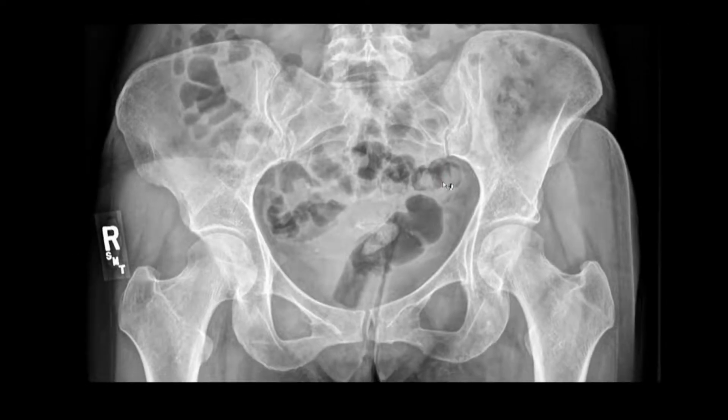This finding should be given an acuity ranking of urgent, and further evaluation with CT is recommended. This finding should be communicated directly to the referring provider. It can be very difficult to detect sacral fractures on radiographs. We get a projection image of fairly complex three-dimensional anatomy. Furthermore, bowel contents often obscure the sacrum to some extent, as in this case.